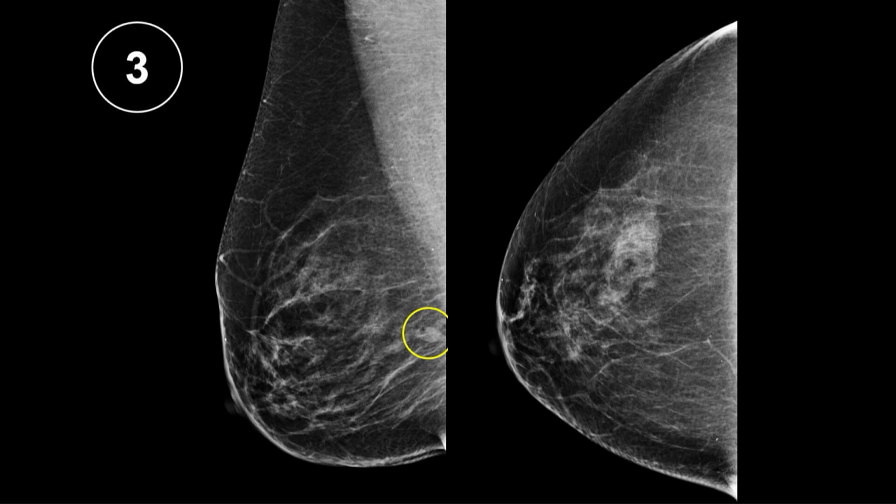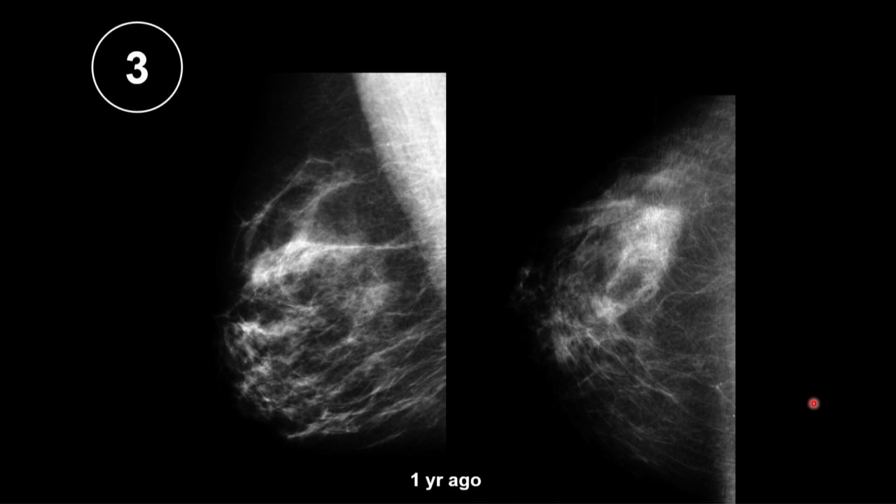So what about that? Well, does this work with the two-step procedure? No, it's too deep. It could not be included in the image field. It could be way out here. It could be way in there. It even could be in the center and just not included in the image field. So we don't have the answer for that yet. So at this point, you're thinking recall. But there is one thing that we could do, and I do this occasionally.